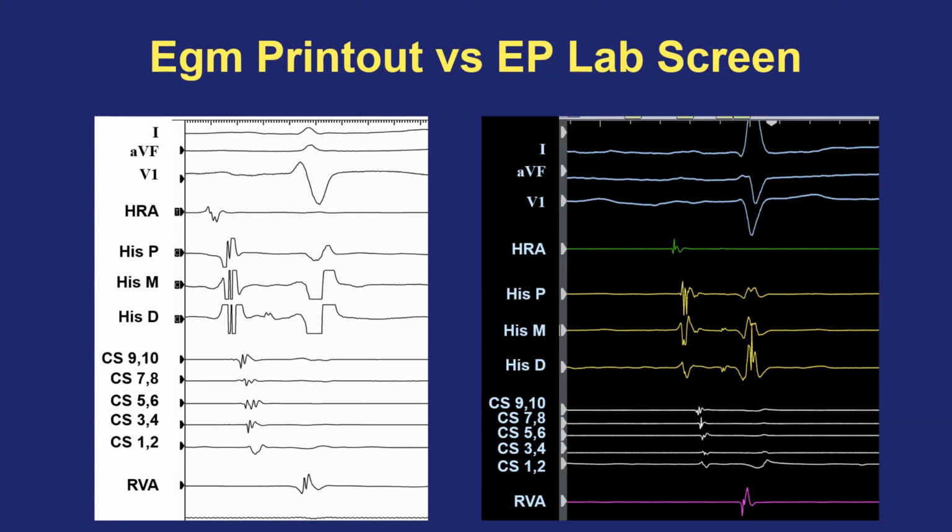But everybody has their own preference, and there have been some debates about what is the convention, and there really is no convention. It's whatever makes you comfortable, but using the same pattern over and over again makes things much easier when you interpret electrograms during an EP procedure.